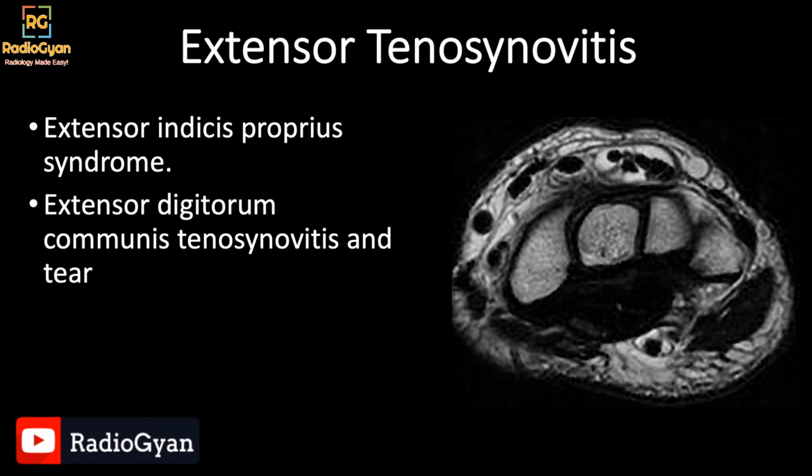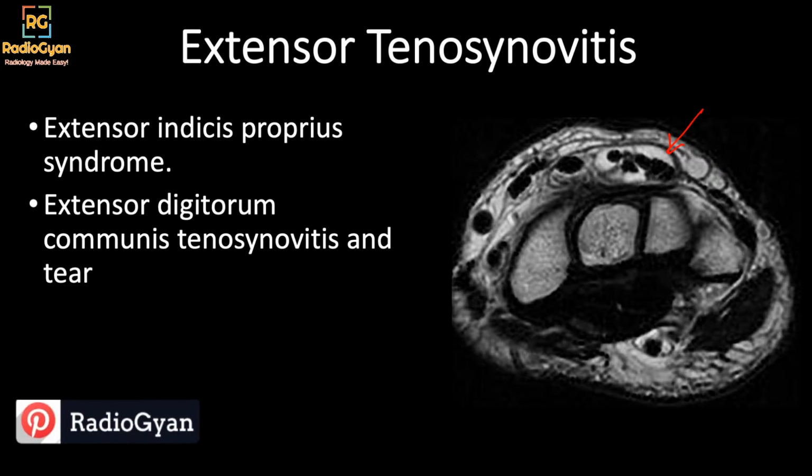Extensor tenosynovitis, there's nothing specific about this compartment. Again, as you see here, this is a crowded compartment. So although there are a lot of tendons here, because they are in their own sheath, tenosynovitis is not very common here.